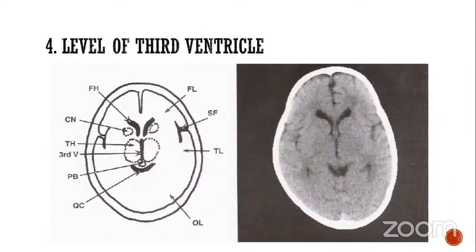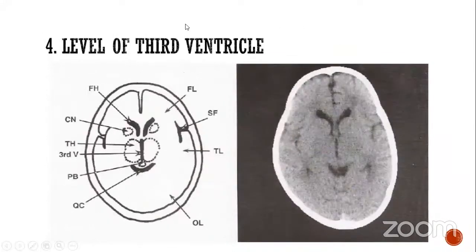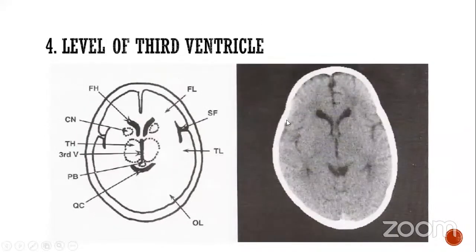Okay. A bit blood supply should have been better. That is the portion. Yeah, this one. Okay. Previous one. Yeah. Actually, my cursor is not working. Okay. So we can see the arrow. Never mind. You can proceed with the arrow. Arrow is visible. That is visible. Okay.